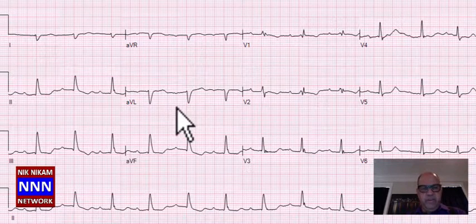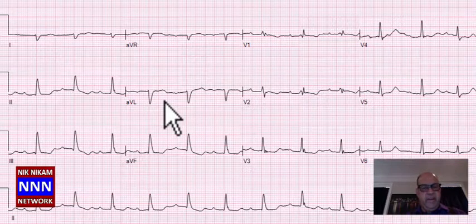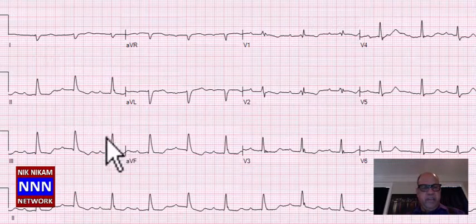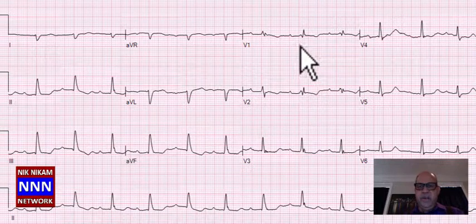Okay, that's so much for the anterior leads. Along with that, there are some STT changes in the high anterior leads. Let's put this to the side. Let's move on to the next. Inferior leads, good R-wave progression, STT changes, suggestive of ischemia, left ventricular ischemia. Anteriorly, we got an RSR prime, which is incomplete right bundle branch block.